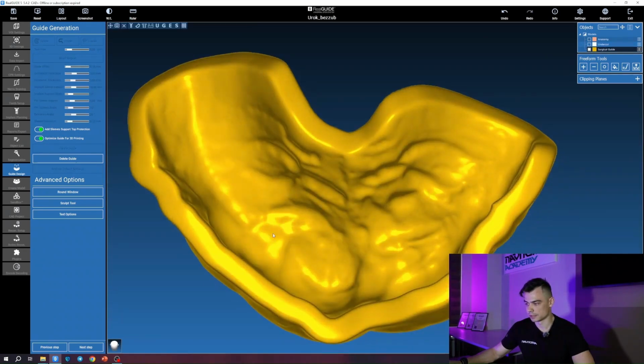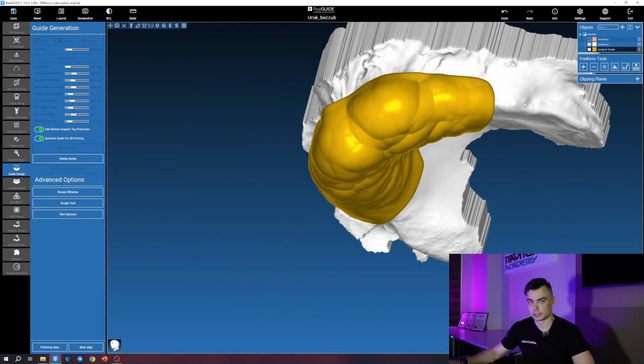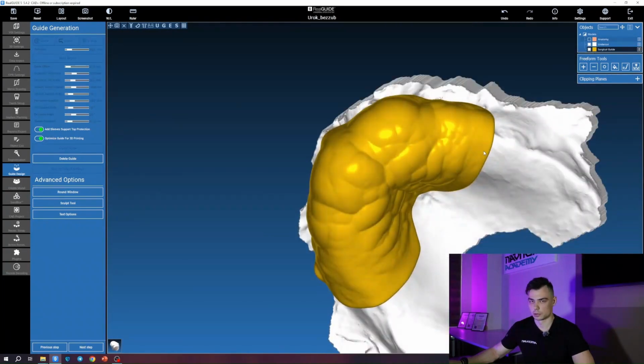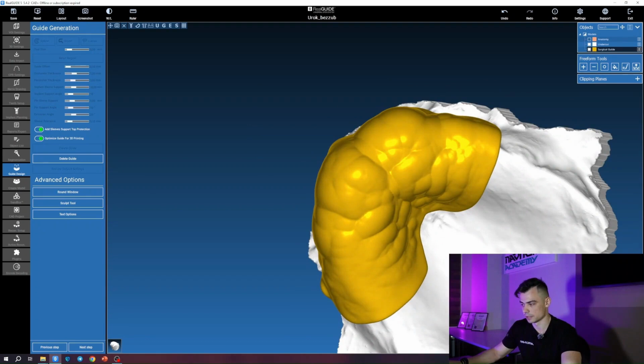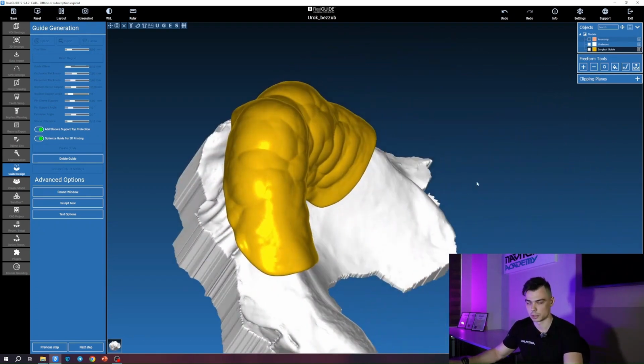So you see, this inner contour is kind of imprinted, and since your model is static, that is, it doesn't bend or flex in space, this area is more than enough for alignment. Let me repeat, there is absolutely no point in making the guide gigantic, covering the entire jaw, and thinking that it's a plate prosthesis. You won't get anything good out of that.